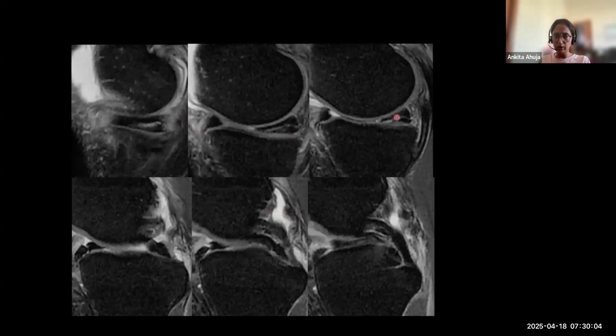You have a horizontal tear over here and you are tracing body, anterior horn, posterior horn, but size wise everything looks okay. Although we are not able to see the body entirely, which we'll see on the coronal, as I go towards the intercondylar region, I see some extra thing lying over here. So when you start to see something extra in the intercondylar region, that is your bucket handle tear. And this extra thing along with the PCL gives you a double PCL sign.